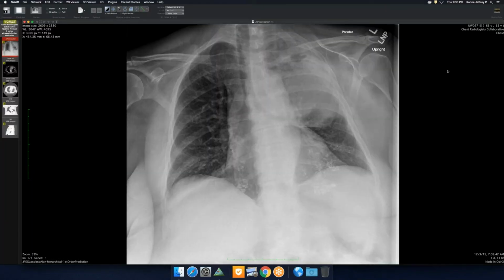So this is a patient. This is kind of a fun case to try to tie it all together on the radiograph. This patient has a large mass in the left upper lung, and you can see there's cavitation in it. But what's important is recognizing this high attenuation branching material in the lower lungs. This could be a neoplasm, of course, but with this big cavitation, there's mass effect on the trachea. This looks like barium, and indeed this was from an aspiration during a swallow study.